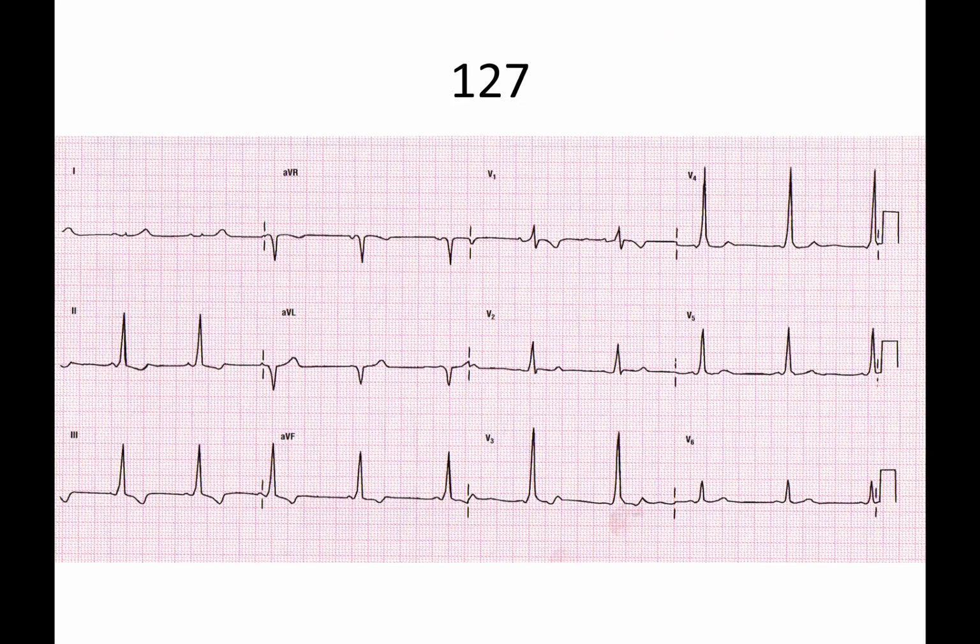All right, next one. All right, so number 1, rate, number 2, rhythm, and I apologize, there's no 2-lead on this strip, but we have a rate of right around 55 because you used the small box method to count those out. And then you also have a rhythm of sinus Brady.